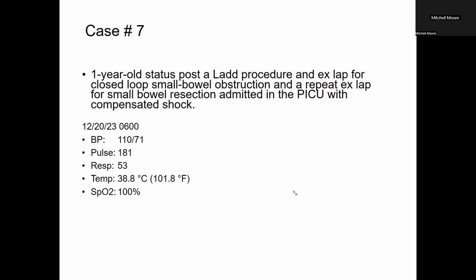Exactly. Yeah. One way to think about it is you can try to mark out the boundary of the pneumothorax. The way you would approach that is to scan in two different planes, sagittal and transverse, and try to figure out where the boundary of this pneumothorax is.